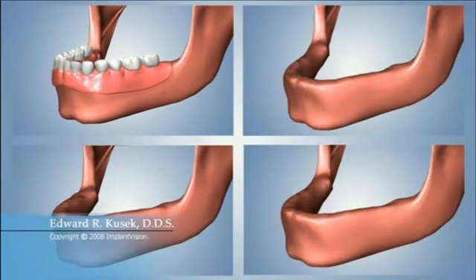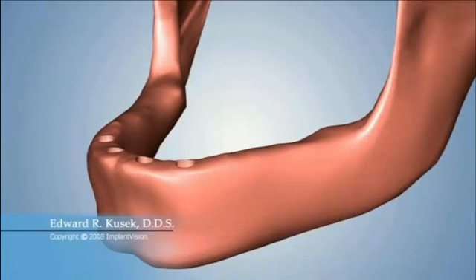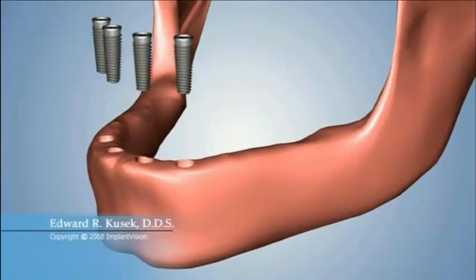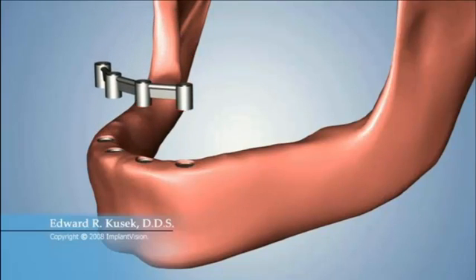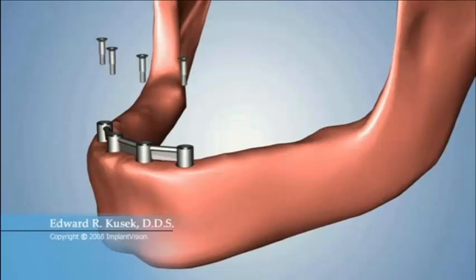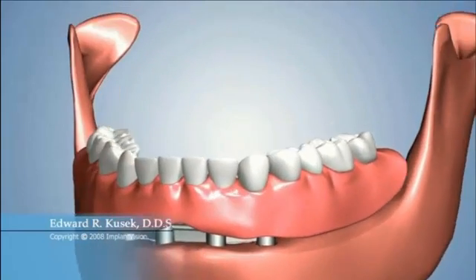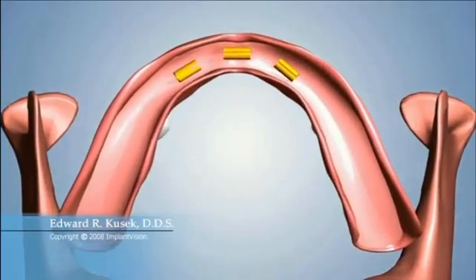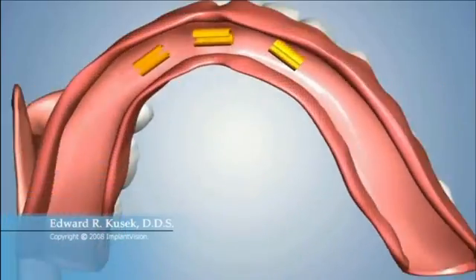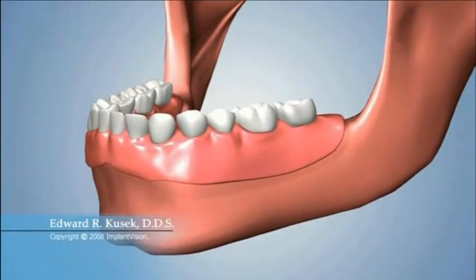A second option involves the placement of 4 dental implants. A customized bar is fabricated and attached to the implants. A denture is designed with clips that securely snap into place over the bar. This type of connection is known as the bar and clip attachment. This denture may also be removed by the patient for cleaning.